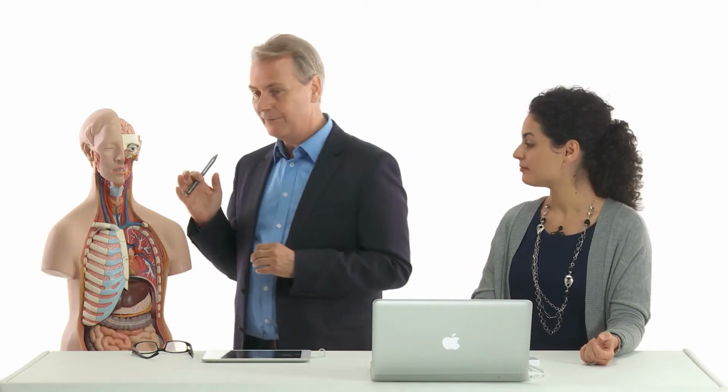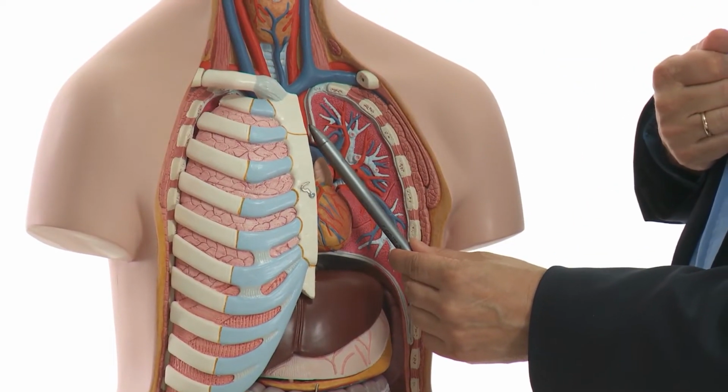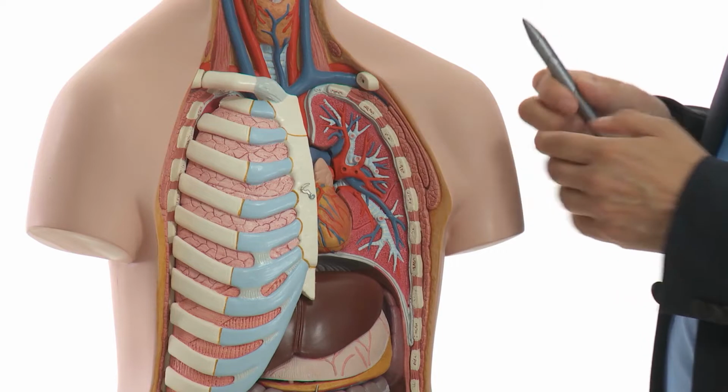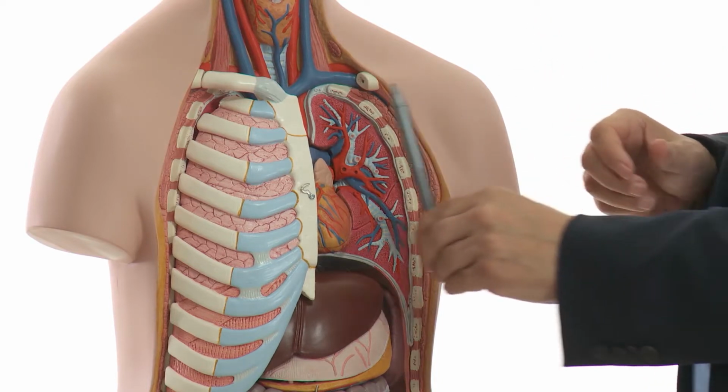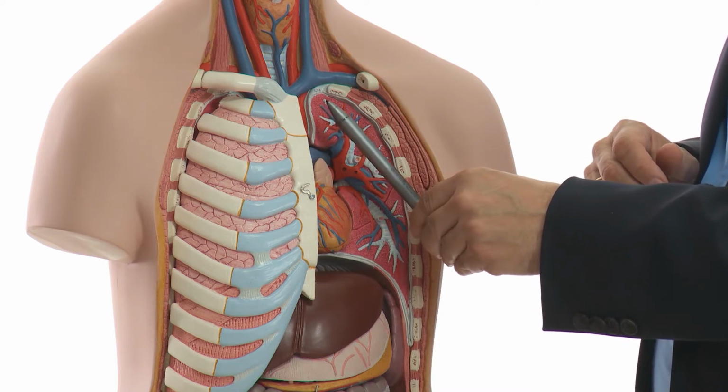So I want to show you on this model. Now, if you have a patient who has a normal habitus, the axis of the heart from the base to the apex will be something like this. Now, if the patient is very obese, the diaphragm will be more cranial. This means that the axis will change. The apex will turn, first of all, more cranial and also more lateral.